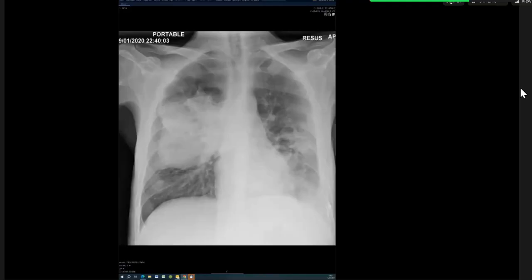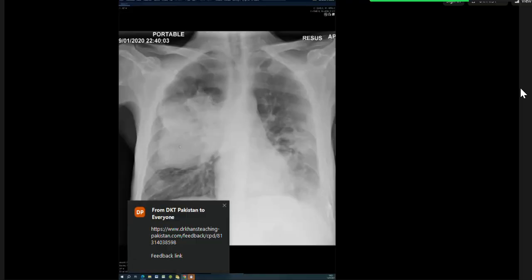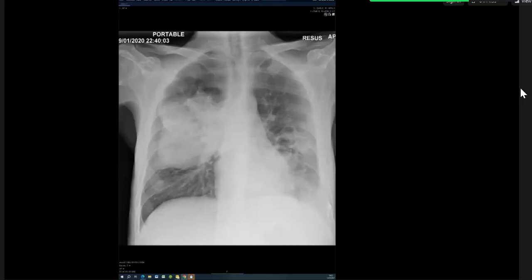This can be pulmonary hemorrhage if the patient has a history of collagen disease or an abnormality like a bleeding tendency. So I would like to review the clinical history of the patient and see if previous X-rays were done to compare the course of the disease. I would like to communicate the findings with the referring physician and ask for further CT for more characterization.